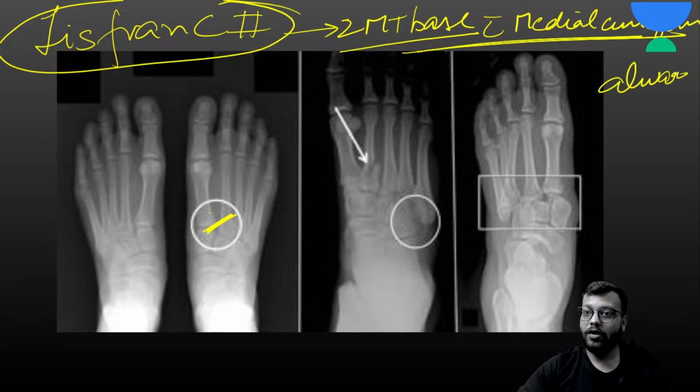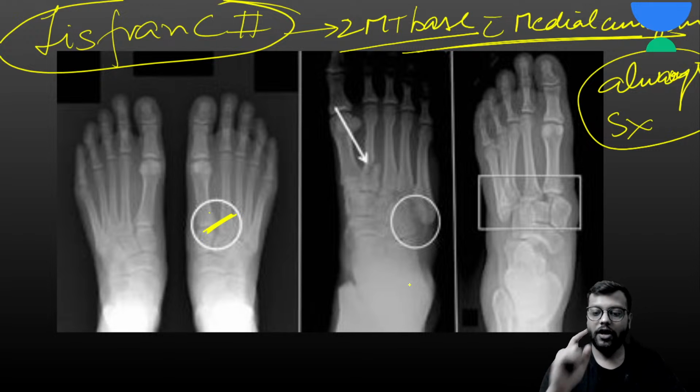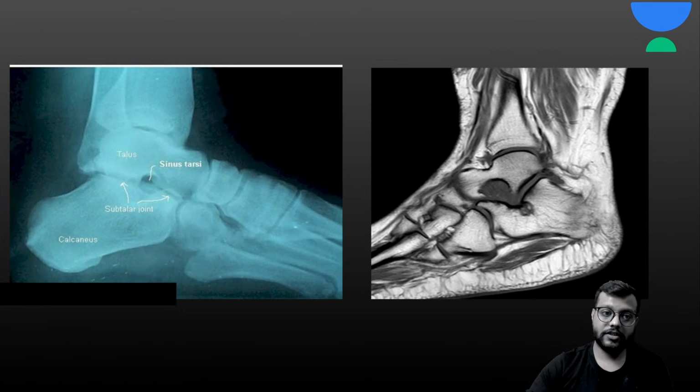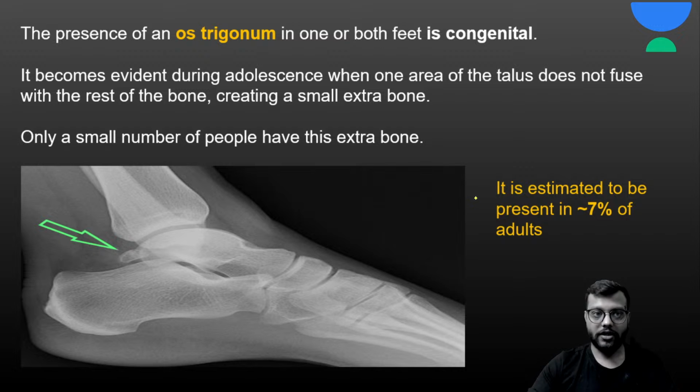always managed सर्जिकली. ओके, कभी भी इसको आप कंजर्वेटिवली मैनेज नहीं करते हो, हमेशा सर्जिकली यू नीड टू मैनेज दिस. दिस इज योर लिस्फ्रैंक फ्रैक्चर, वेरी इंपॉर्टेंट. ओके, नाउ नेक्स्ट इज दिस इज योर साइनस टारसाई. एंड इन एथलीट्स जिसमें ज़्यादा यूज होता है फुट का, सो देयर मे बी इन्फ्लेमेशन ऑफ दिस लीडिंग टू द साइनस टारसाई सिंड्रोम. बस आपको इतना सा ही याद रखना है, मैनेजमेंट इज conservative.